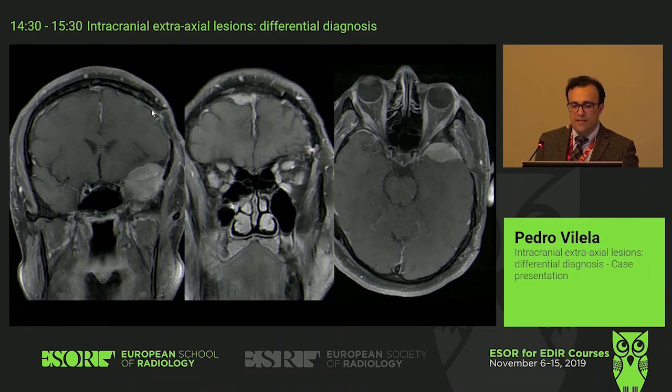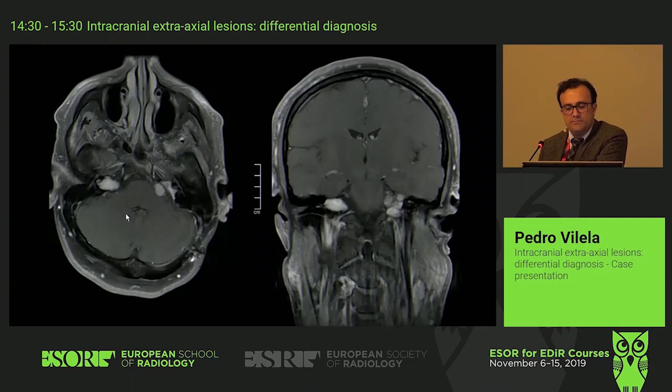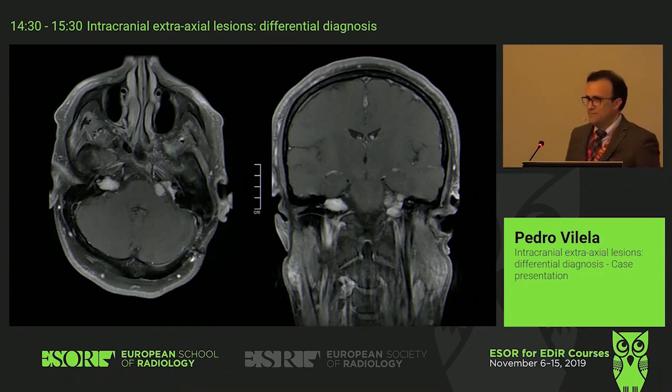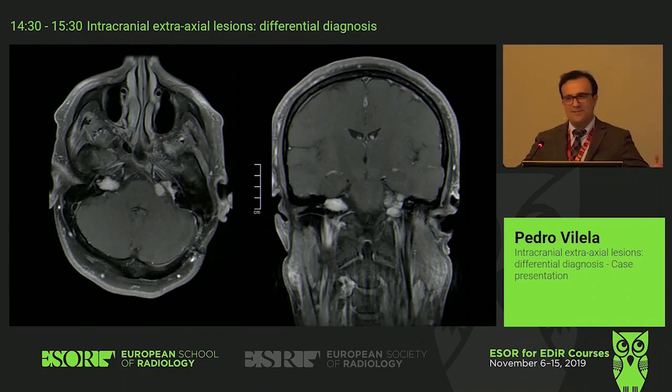Two of the same kind. Actually, this patient has been operated. Okay, this is a post-op. So I have one here, another one here. More lesions or not? NF2. Very good, very good. So we have multiple meningiomas.